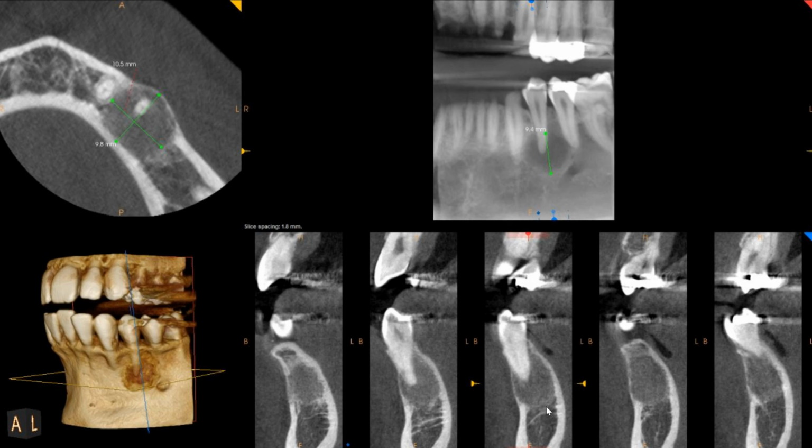I would like to have seen a panoramic radiograph or PA of this a year ago or 2 years ago, and see if that was still present. If it was more loose back then and gradually filling with radiopacity, that's evidence that the patient is healing. And this, to me, looks like a kind of woven bone, the immature bone that is just calcifying. So that's probably what it is, given also the fact that the pathologist sees only normal bone under the microscope.